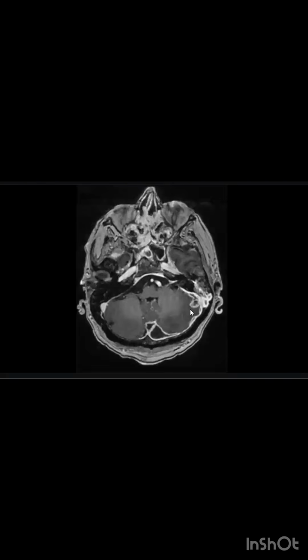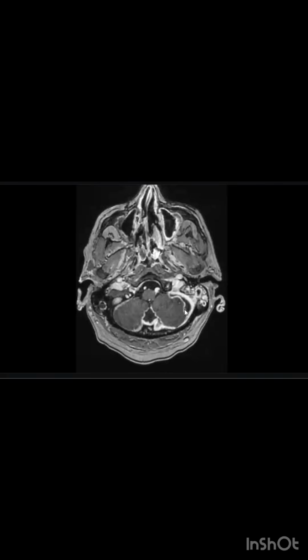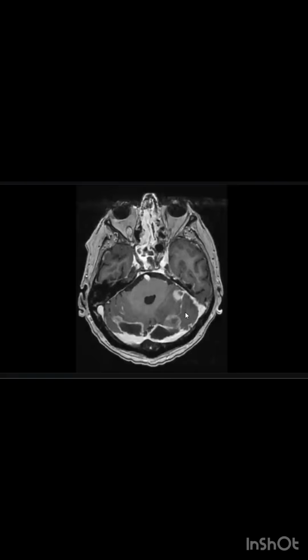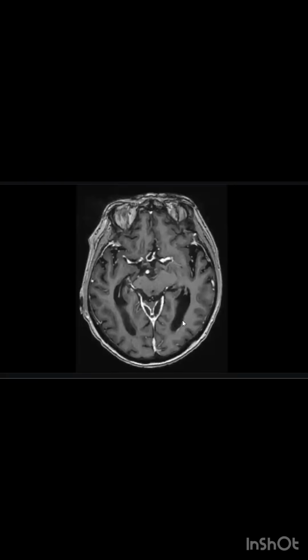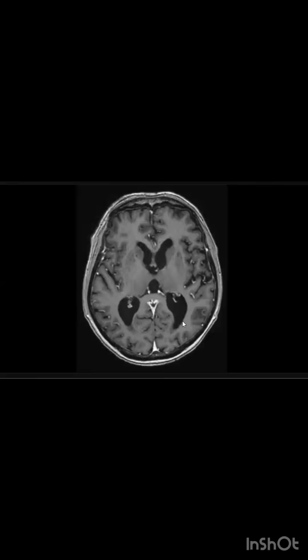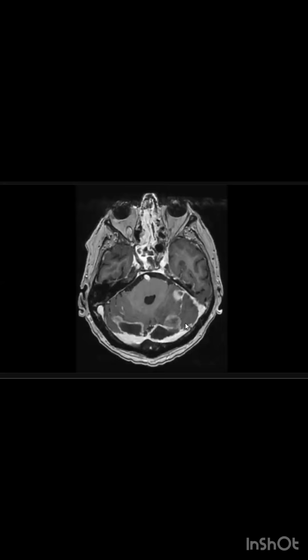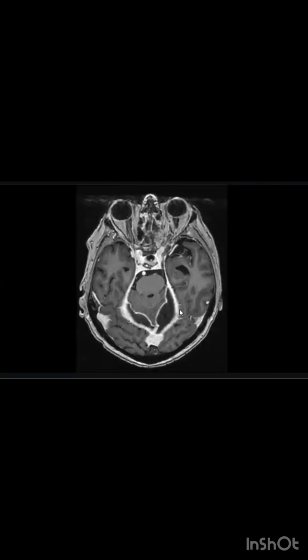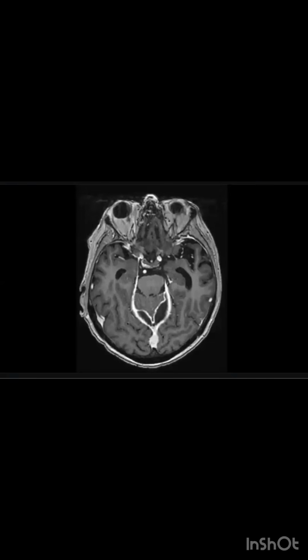So it's an extensive infective inflammatory process involving the left mastoid air cells with posterior fossa collection formations along the tentorium cerebelli. I will urgently convey the findings to the neurosurgical team. This patient might need drainage of these collections and culture sensitivity and antibiotic treatment accordingly. Okay, thank you.